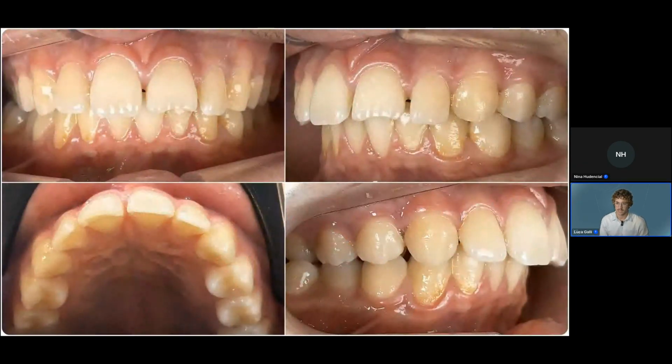So intraorally, our primary focus is the severe right side discrepancy. The cusp of the upper canine falls directly on the center of the lower canine, with a similar relationship on the premolars.